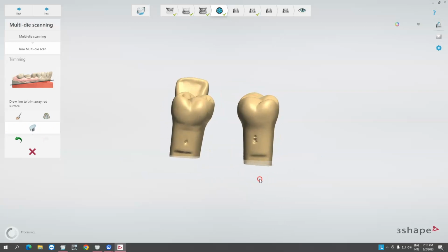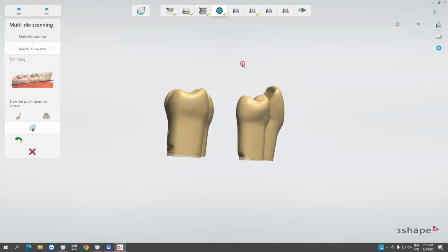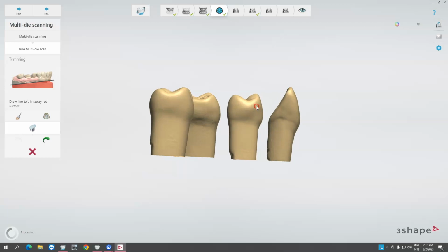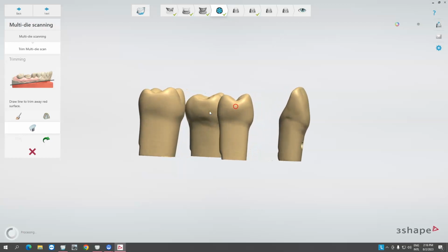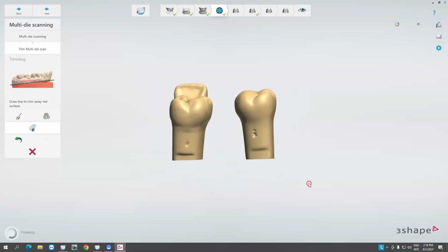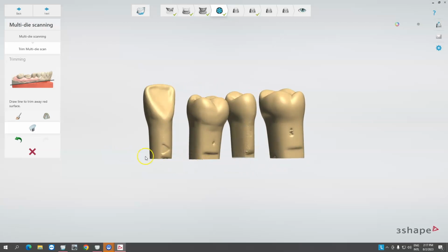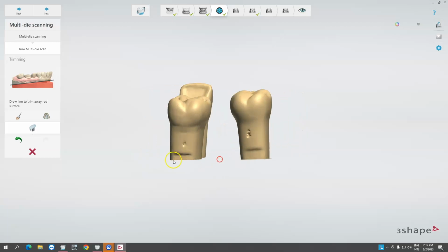Now all of these have an angled base. If I wanted to fix that, I would make it so that the bases are more flat. So let me undo that. Here they are flatter, and let's try something like this. So now I've got a more crisp cut. It barely took off anything, which is what we're looking for. And these are just how they were scanned, a little bit of an angle over here. But we will move on now.